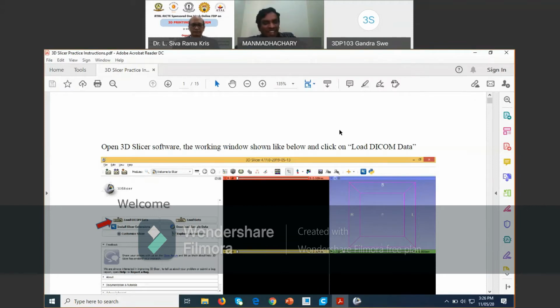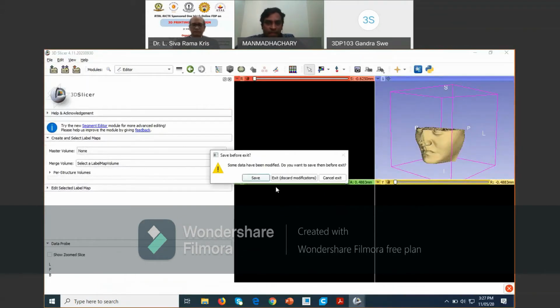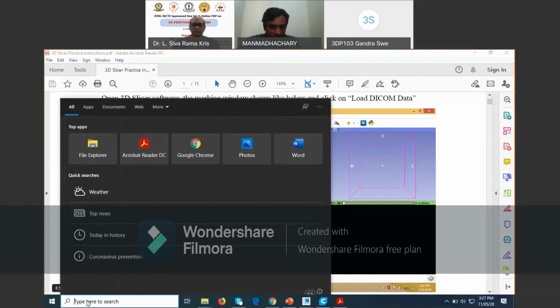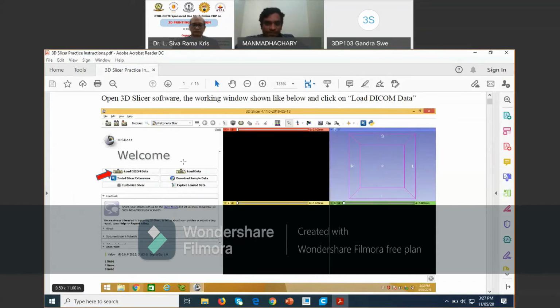Here you already have the 3D practice instructions PDF. Please open that. Here we are given the step-by-step procedure. First, we have to load the DICOM data. Once again, I'm opening my Slicer software. Please, all of you open the 3D Slicer software on your laptop or desktop.